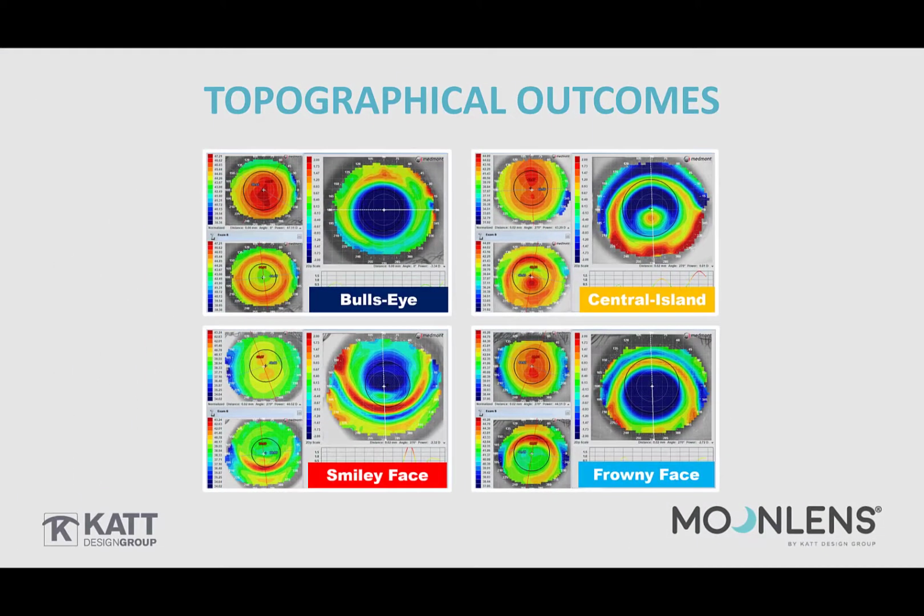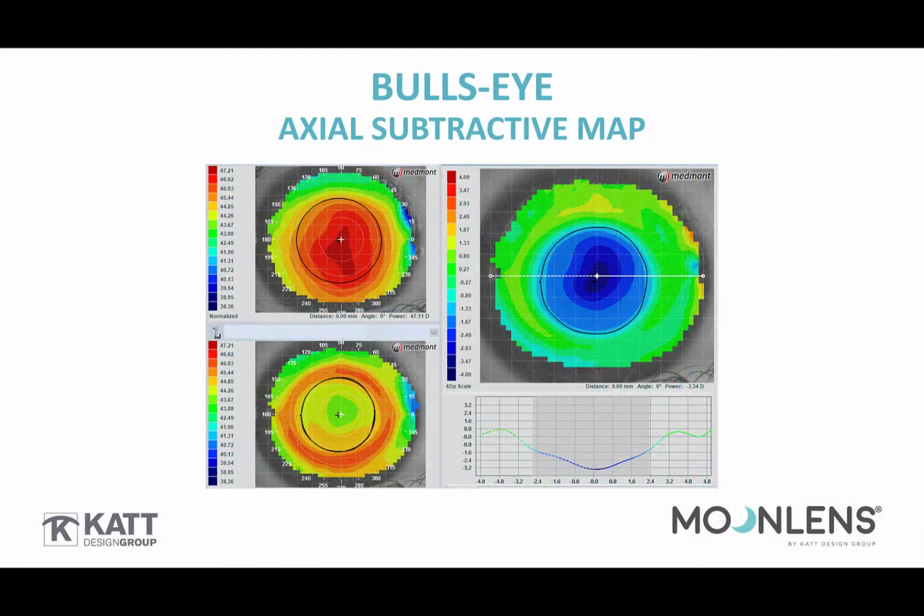Each of these post-treatment outcomes tells you exactly what you need to do next. And the subtractive map function is the key to this analysis. Understanding the importance of this tool cannot be overstated. The subtractive map will allow you to analyze the outcome in multiple ways.